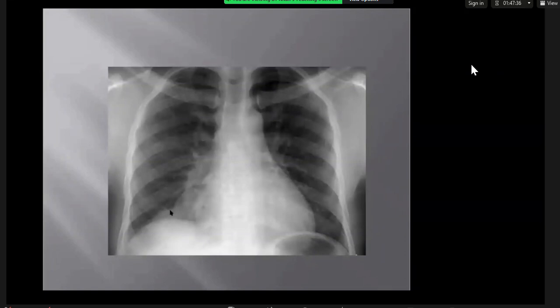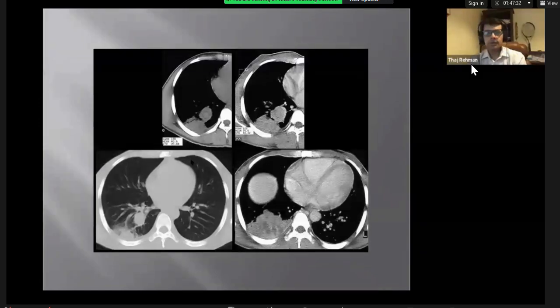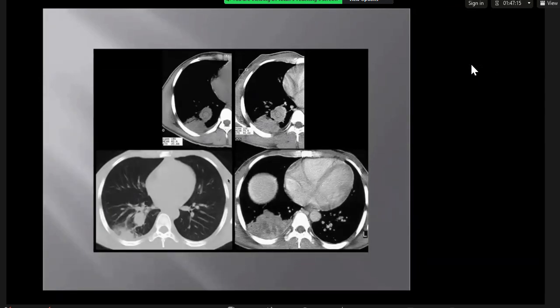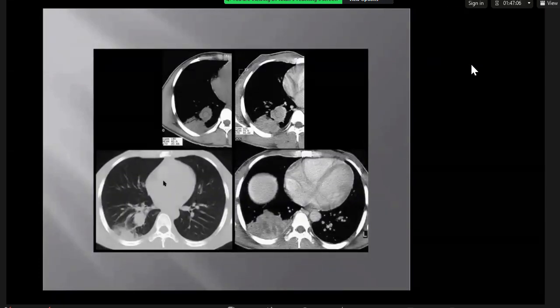Yeah, good. So I get a CT. Fantastic, which is what you're given. Yes, so it's a heterogeneously enhancing mass lesion, peripheral in the lower lobe, as we localized before. I can say there is another large satellite nodule related to it, cranially. So that's the mass, and there is distal consolidation because the mass is causing obstruction. It's pretty straightforward.